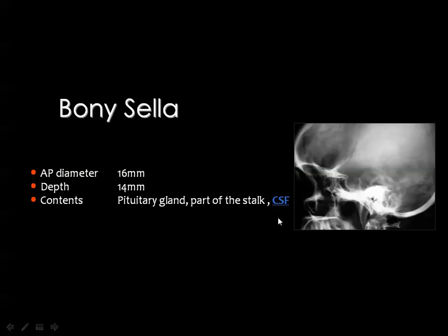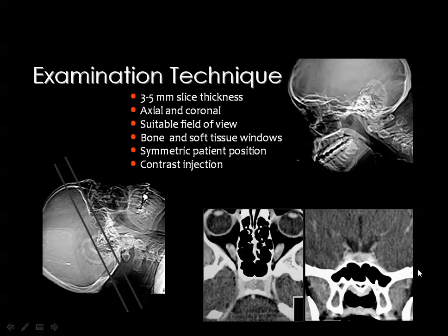And this CSF is normally present within the sella, and I want to say that because sometimes whenever you see some CSF inside the sella you think that this is an empty sella. No, the diagnosis of empty sella will depend on some of the facts that I will mention very soon.